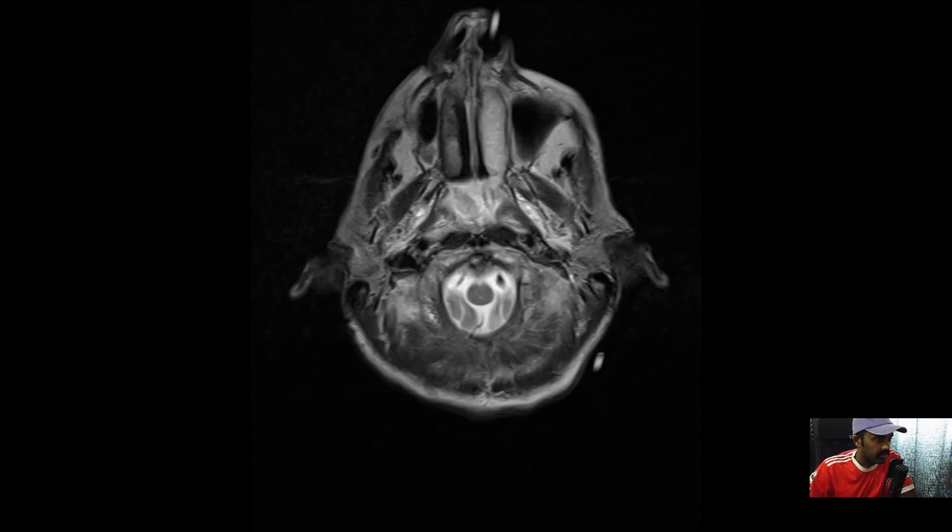Let's have a look at this patient who's an 80-year-old lady who presented with decreased level of consciousness. A CT scan was done initially, which demonstrated multi-compartment bleed. So the patient was referred for an MR angiogram and venogram without IV contrast, to pick up any sort of aneurysm or venous sinus thrombosis that could be the etiology for the bleed.